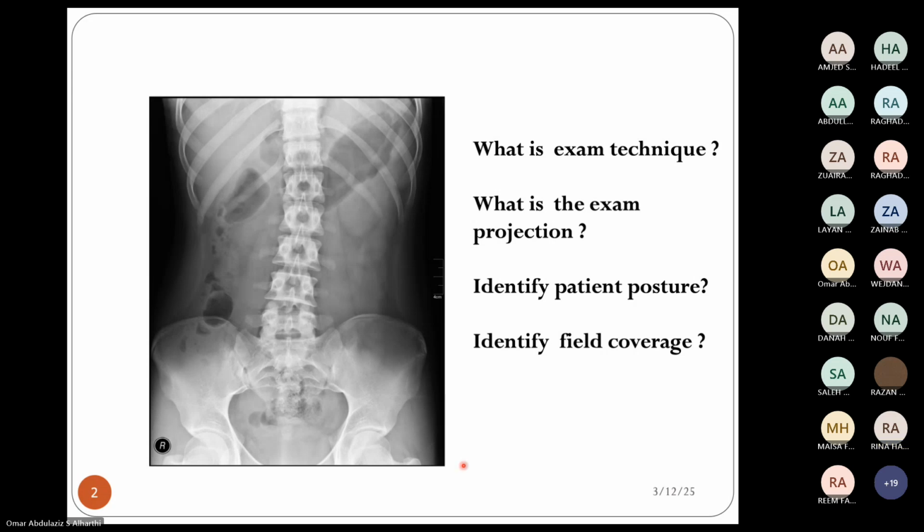X-ray. Okay. What part of the body? Abdominal X-ray. Okay. What is the projection? Anyone?